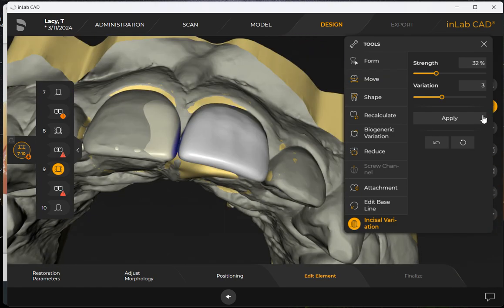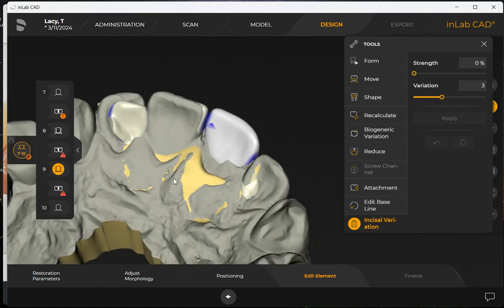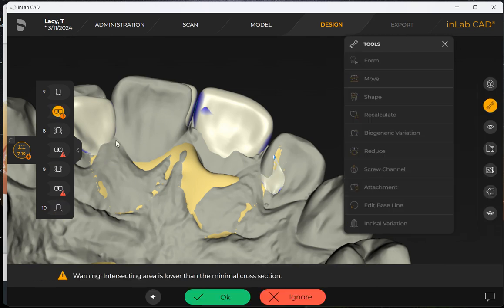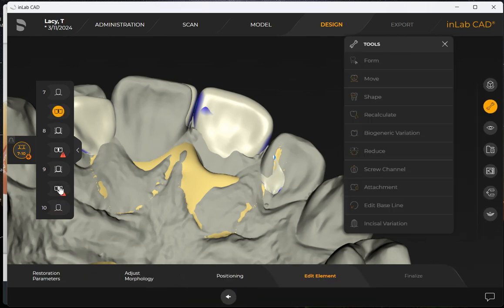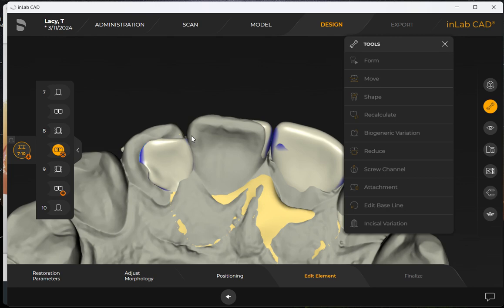And overall, we're going to click apply. Now what the computer's telling me right now is it doesn't really like our connectors, which is fine, not a big deal. It's telling me that I've got some invalid bridge connectors. If that happens, again, it's not a big deal.